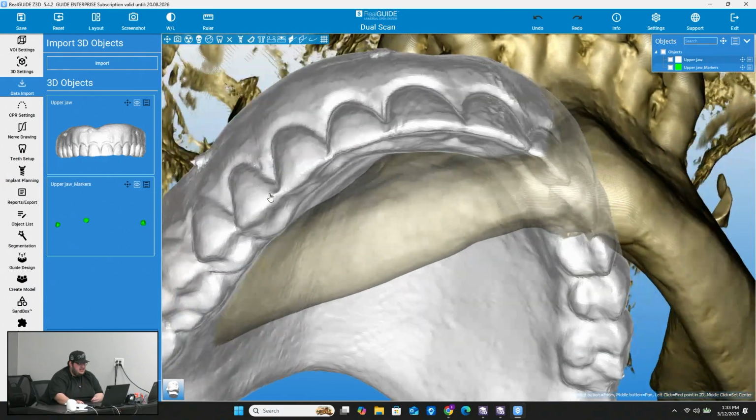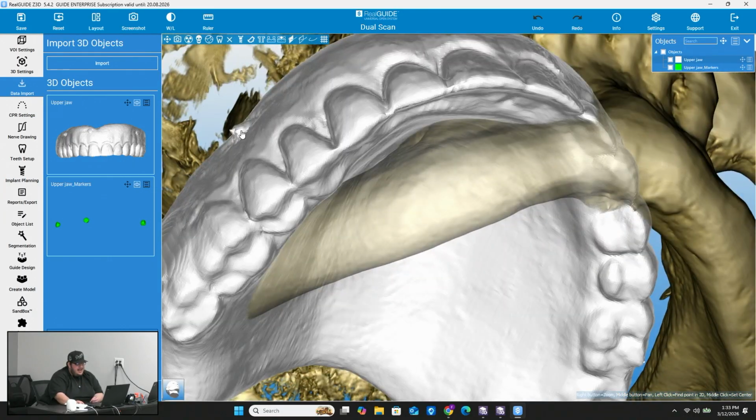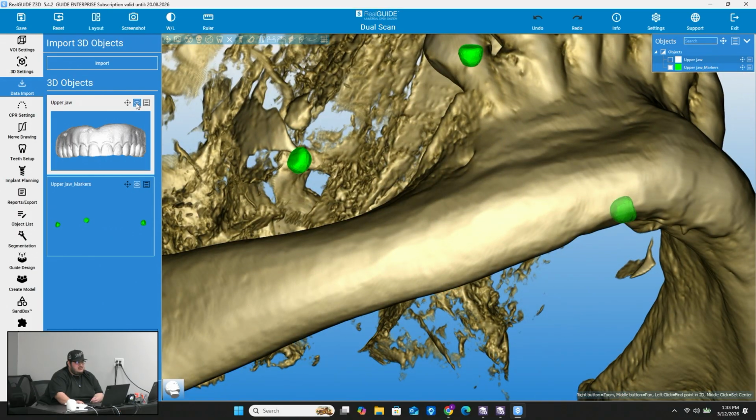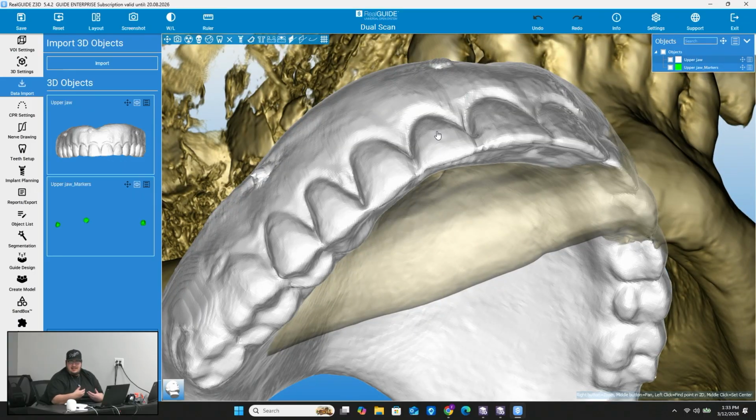You can almost see it in this one on this left side. It's actually pushed out a little bit more, but if we look at the markers, look how flat it is. That's because we're showing less dense areas.